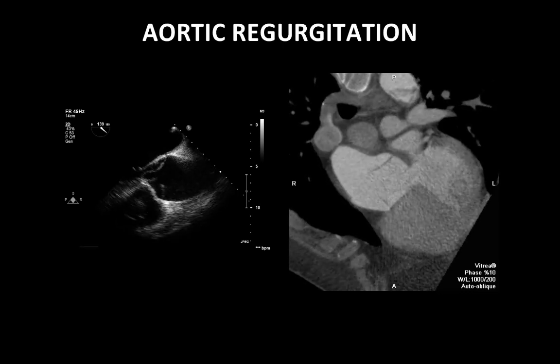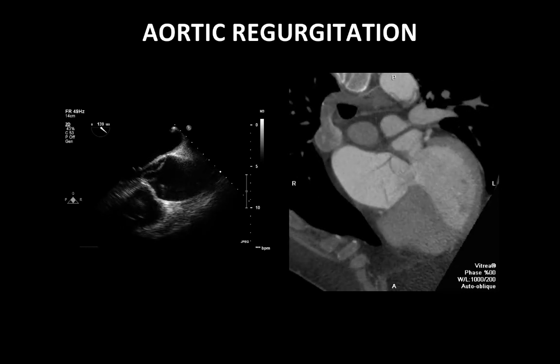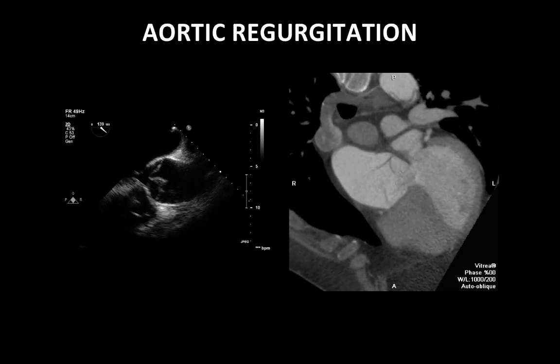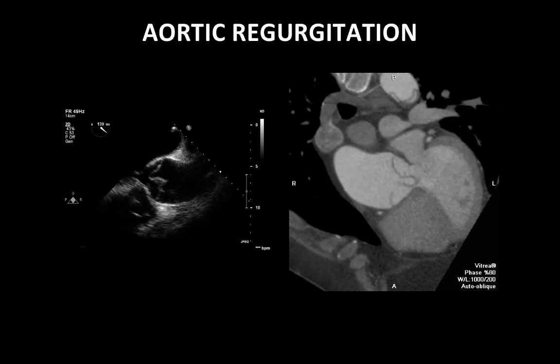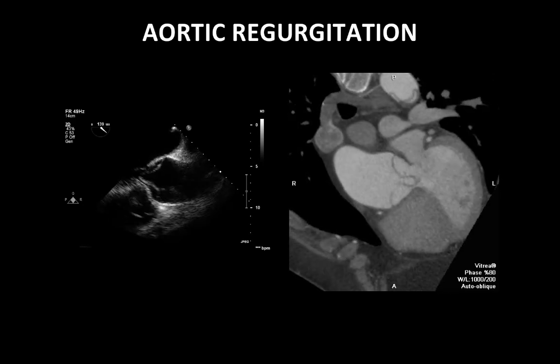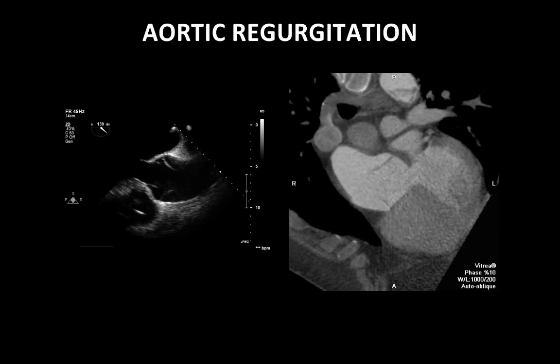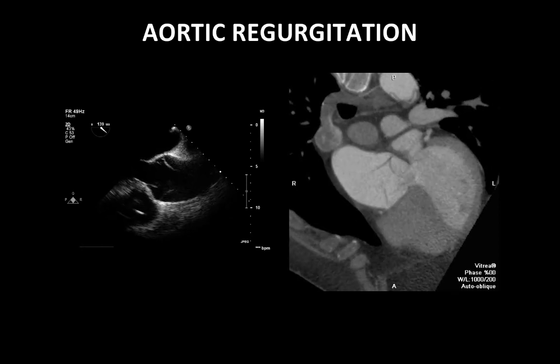It's part of the routine workup and the evaluation of the patients in the operating room in preparation for the ascending aorta dissection repair. But this is something that you can also see with CT or MR. On the right of the screen, this is an example of a patient that we scanned a few years ago when cardiac gating was done only with retrospective cardiac gating.